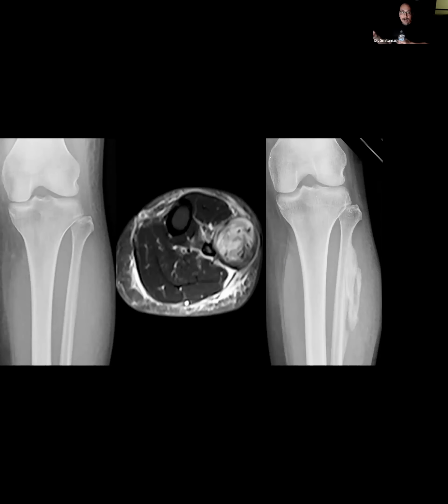When it happens chronically, okay, this can result in atrophy, fibrosis, or as in this case, calcification. The patient came in, in this case, pretty normal, just some non-specific soft tissue swelling laterally. We got the MRI, and we can see ultimately this led to calcific myonecrosis. This is an Aunt Minnie, or what I like to also call an Uncle Mickey, but usually it's going to involve the anterior compartment of the lower leg. It loves to involve this part of the body, and typically this happens after trauma, so you're going to be looking for an associated fibular fracture or tibial fracture. Okay, so calcific myonecrosis.